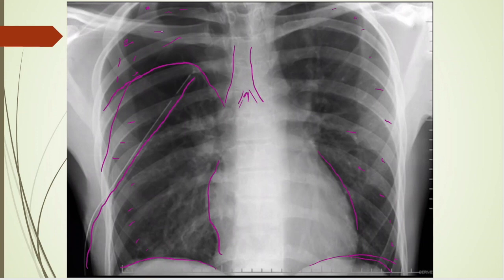So this patient still has a pretty good size pneumothorax. I would check this chest tube and make sure the chest tube holes that you find are all the way inside. Make sure it's not plugged, but something's going on and this needs to be corrected here. So you've picked out, patient has a pneumothorax still in spite of already having a chest tube inserted. It probably needs to go in a little bit further.